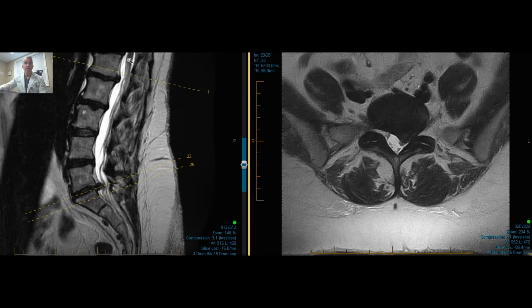At the very top is the tail end of the spinal cord. A lot of folks think their spinal cord goes all the way down their back. It actually doesn't. It stops right here, just about level of your rib cage, or just below the rib cage, such that the only things that come down are just the nerve roots themselves, or these little strands, and they travel down through this sac of fluid. And it's actually an enclosed sac.